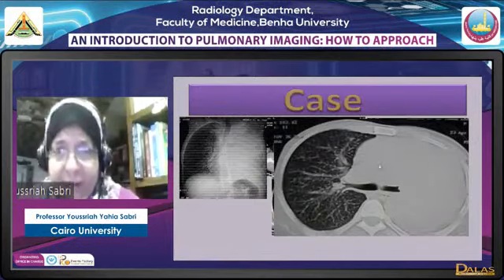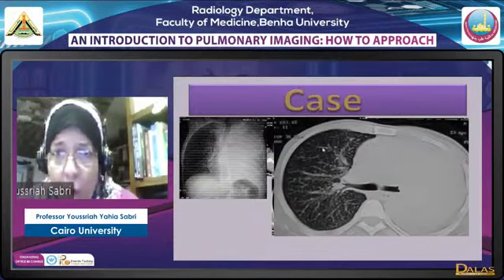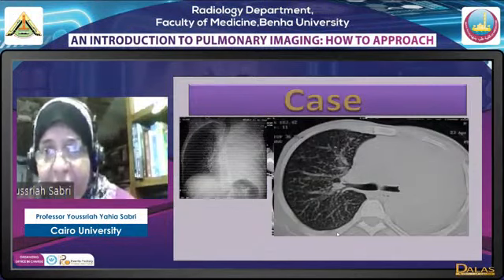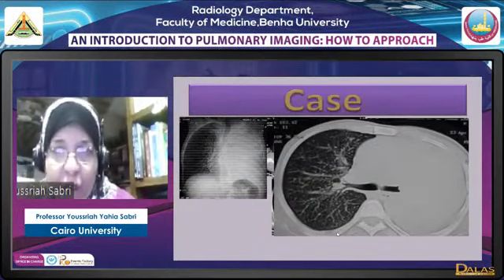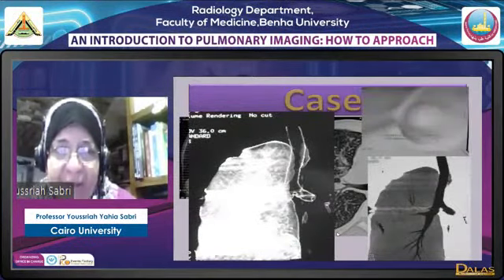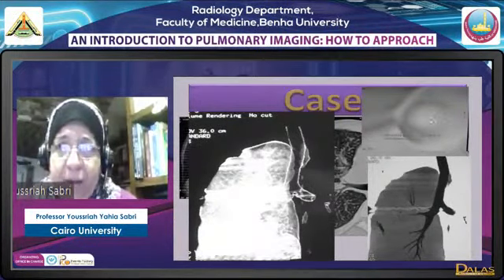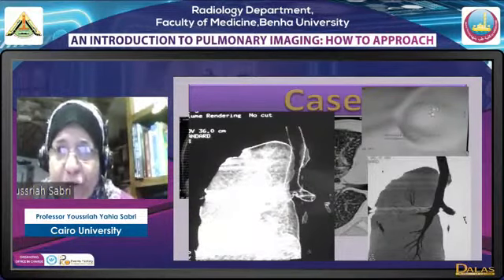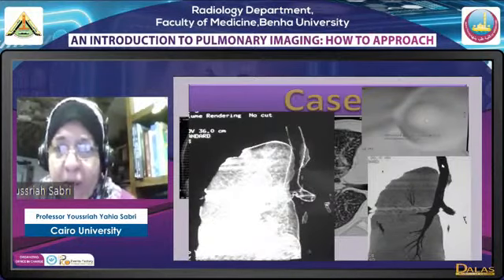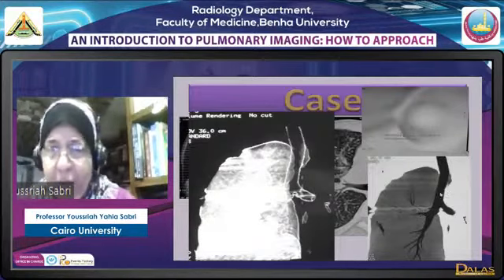Now look here at this lung window. This is a conventional CT study. Still you see the coarseness of the right lung due to lymphangitis carcinomatosis. This is how lymphangitis carcinomatosis will look in a conventional CT study. And you see, of course, the obstruction of the left bronchus. Now this is a virtual bronchography, okay? The upper one on the right image is the VB image, which is a 3D image simulating the bronchoscopy, and you see the total obstruction. The one on the right below is the MINIP image, and you see the bronchial tree. You see whatever is black here.